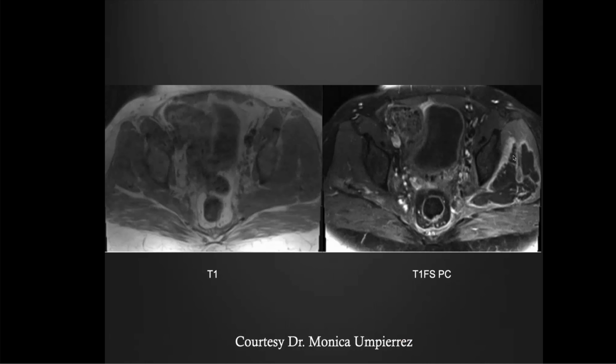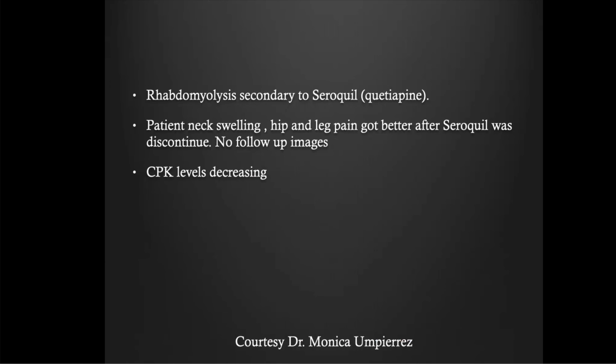Okay, so here's post-contrast, and there's a lot of the area inside the gluteal muscles on the left here that are not enhancing, which makes you worry. So this turned out to be rhabdomyolysis, secondary also to a drug reaction.